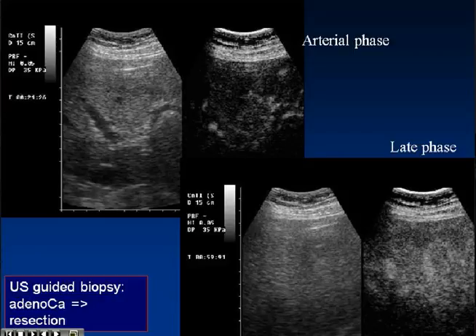So this is not sparing; it was biopsied and confirmed to be a metastasis. And during the follow-up, you understand that CEUS, being so safe and less expensive, is better than radiation techniques if the liver can be explored in a good way.